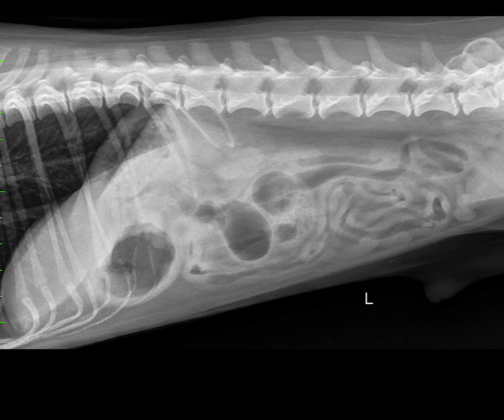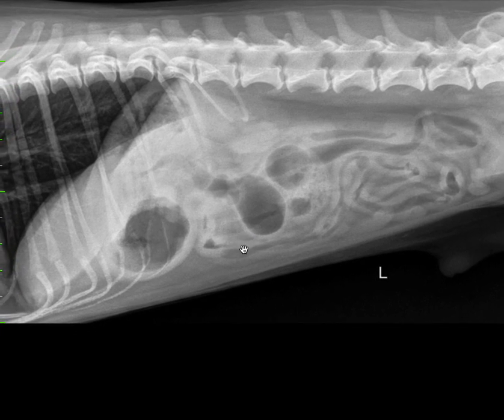This is a 6-year-old Chihuahua with acute vomiting, diarrhea, and hematochezia. Once you have reviewed the radiographs using a systematic approach, then you're ready to watch this video. Now, although this is a patient with gastrointestinal signs, I would like to use this as a chance to talk about assessing liver size on radiographs.